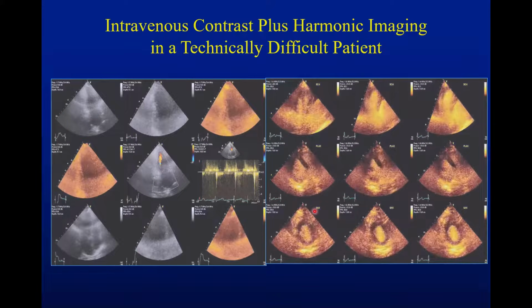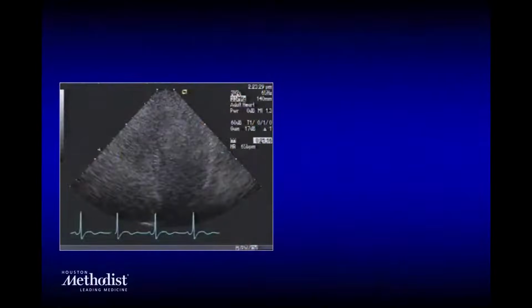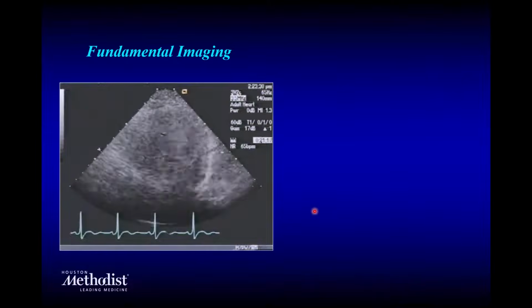If you use contrast, and these are the second and third generation of contrast material, it goes through the pulmonary capillaries and goes to the left side, and this is where you can see much better. It's almost like you put the light on of the heart function, the heart borders, the hypertrophy that there is in this heart. So there are multiple applications for contrast echocardiography.